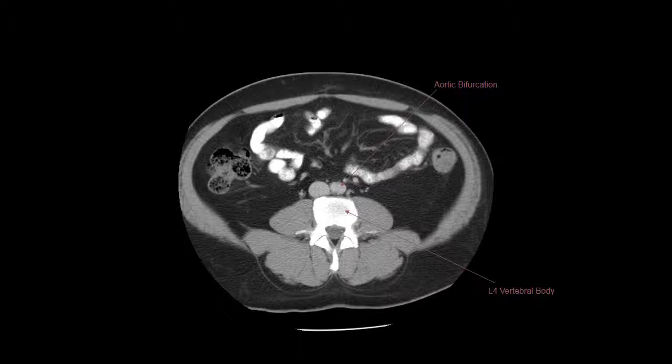We happen to be at the L4 vertebral level, as noted here. And I know I'm down in the pelvis because I'm seeing only bowel basically at the moment. And here's my colon for sure because it's dried out bowel versus all this nice solid white contrast bowel. I don't see any kidneys, I don't have a liver, I don't have a spleen, I don't have any ribs showing up. I'm seeing muscles that are consistent with the pelvic area as well.